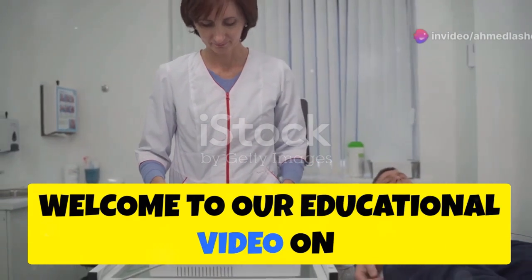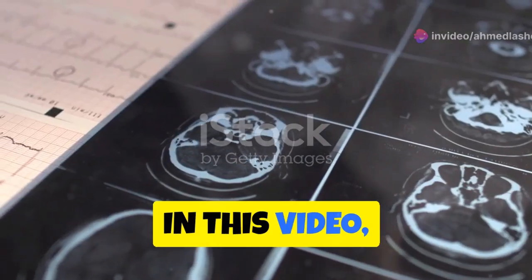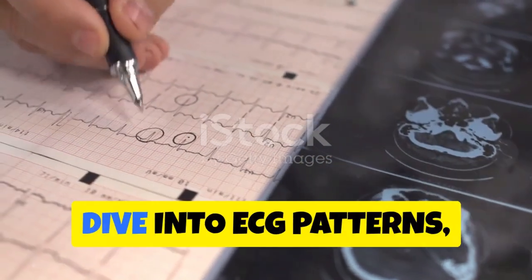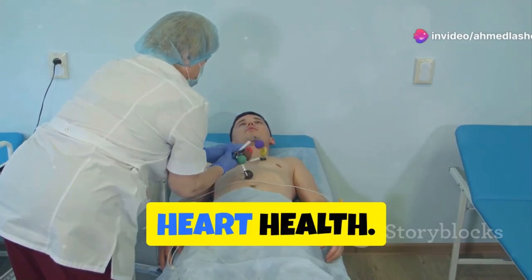Welcome to our educational video on understanding electrocardiograms, commonly known as ECGs or EKGs. In this video, we'll explore the differences between ECG and EKG, dive into ECG patterns, and uncover common ECG abnormalities that can reveal important information about heart health.